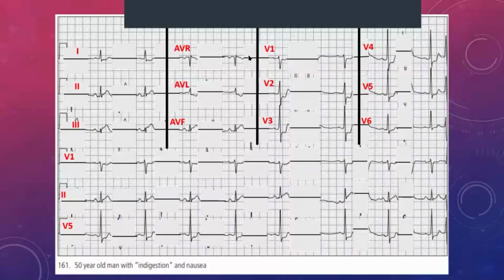So this is what is left over once we do that. So now let's analyze our ECG based just on what we know already. And you can see once you start looking at this, it doesn't look as scary now. We're going to come back to the scary part, and what's making it look busy and difficult. But let's have a look at what we already know.